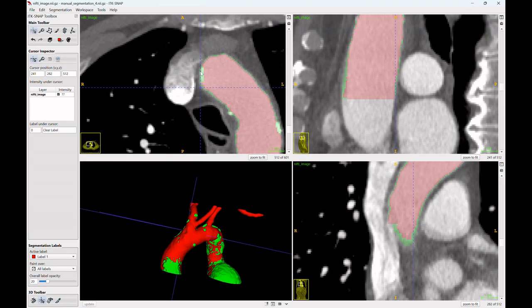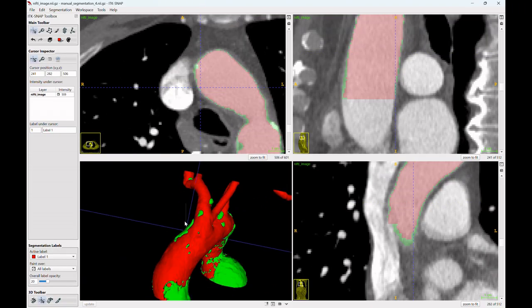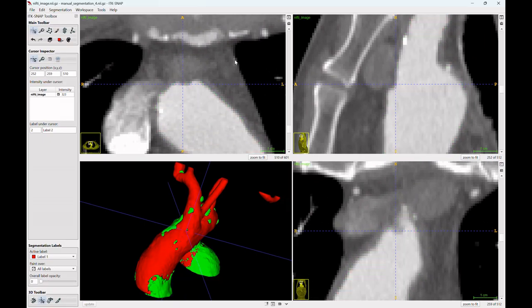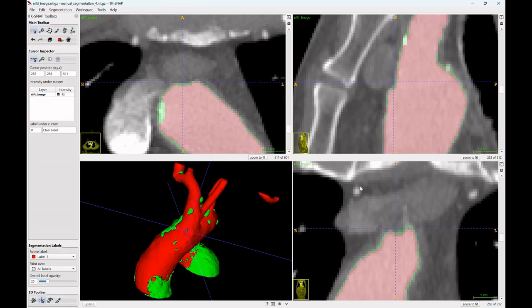Pay particular attention to calcifications, to the boundary between the lumen and thrombus, to any holes or discontinuities, and to areas misinterpreted by the snake. Then, review each slice to ensure overall consistency.